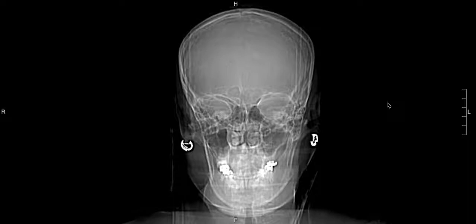They're actually very similar to taking a plain film or a radiograph, and they can stack the anatomy in such a way where it can be easy to tell what foreign bodies are present, if there are foreign bodies or equipment. Certain fractures may be more obvious. In the case of looking at the non-con CT scan of the head, we'll generally have a frontal view, so you can get a good sense and see if there are any gross abnormalities like sinus opacification or fractures. So you can just take a look at the frontal.